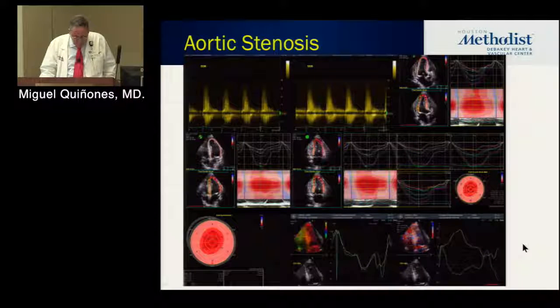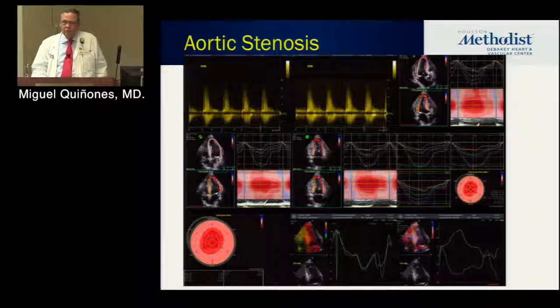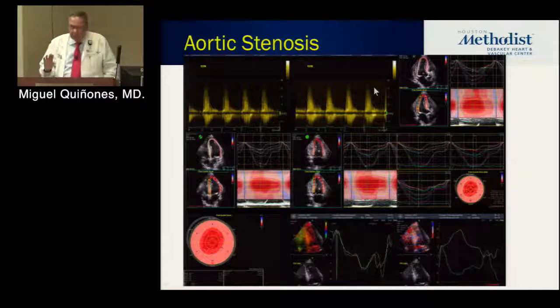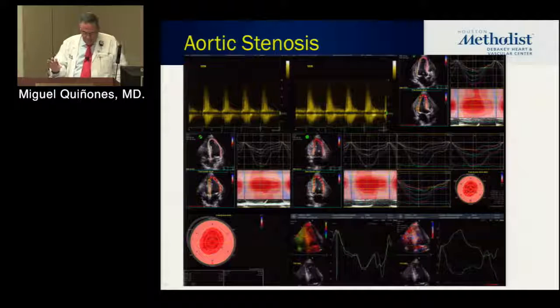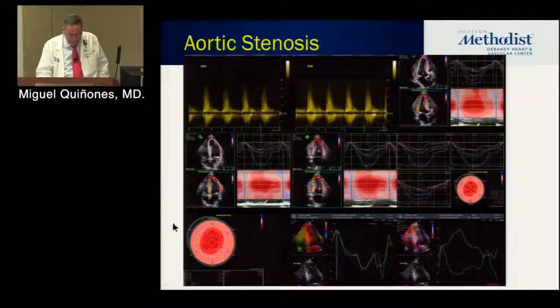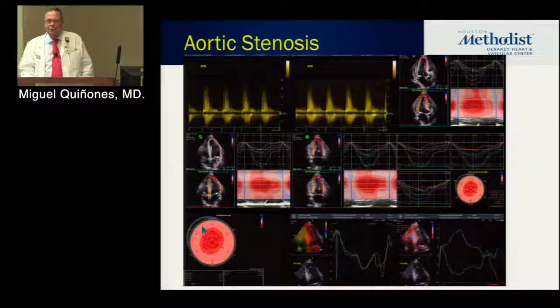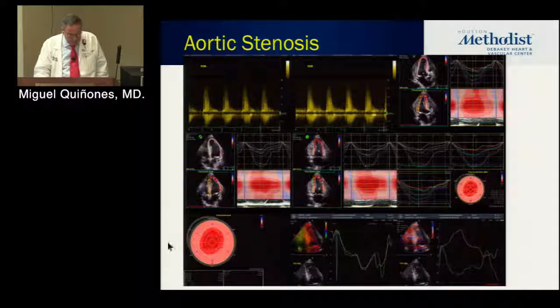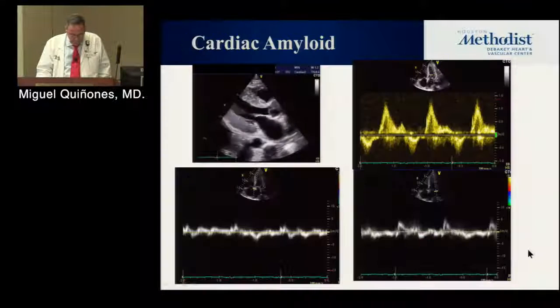Look at this, beautiful aortic stenosis. Classic. Look at the velocity here. Way up, okay? Classic AS. Should we be doing a biopsy to establish amyloid? Nah. So, in concentric LVH, you can get a similar pattern where the apex is more preserved than the base, okay?